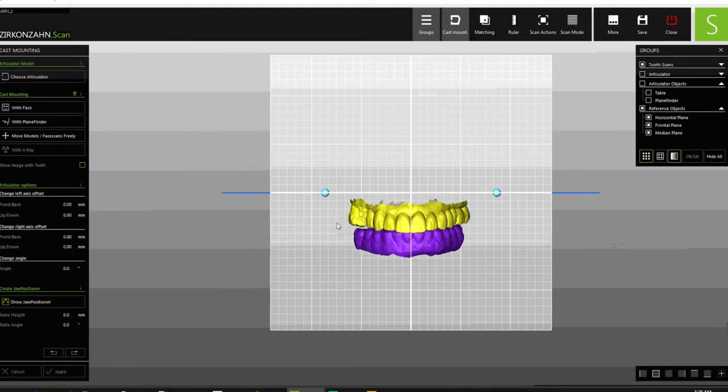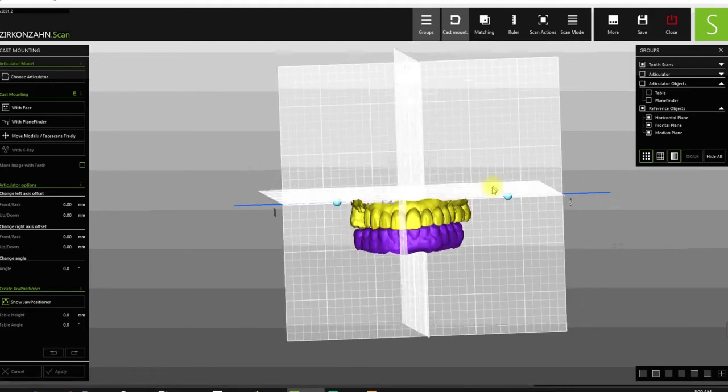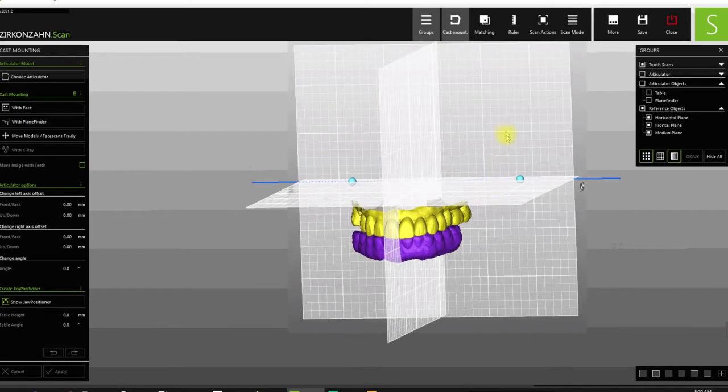Okay. So now there's my scans. They're already lined up very nicely with everything we're doing. I don't want to bring all these in. When you click save, anything that's visible is going to appear, be saved, and be brought into the next step. So I don't think I actually want to bring these. I want our other ones from the face.